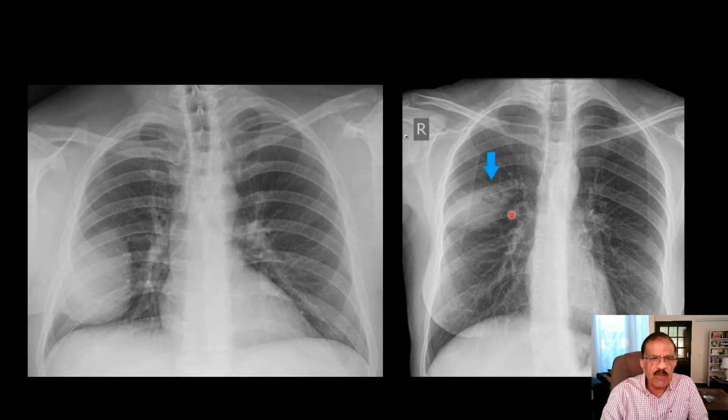This diagnosis may not be easy and can always be challenged, but sometimes if you do an X-ray and then an ultrasound or a lateral decubitus, that will confirm the diagnosis. You have to obviously correlate with the clinical condition. These two may be encysted effusion, this one in the oblique fissure, this one in the transverse fissure. And I'll show you some more images of encysted effusions. They will make the concept better.